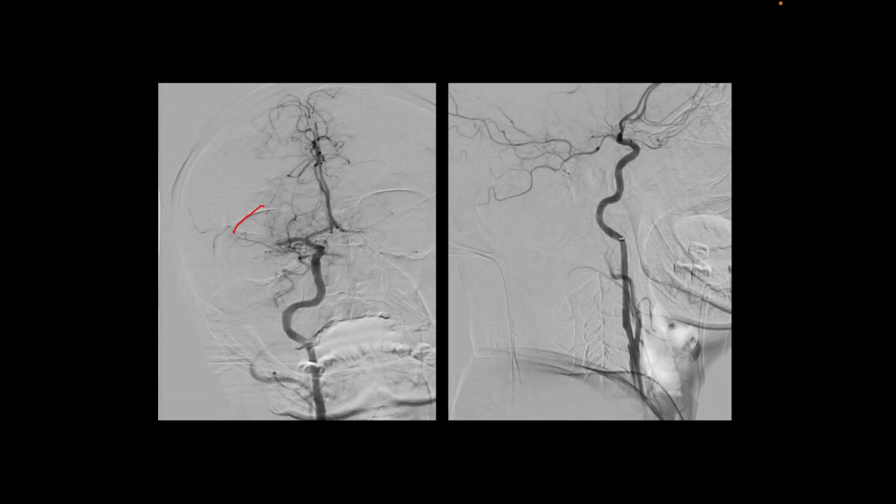Now read the angiogram. On the right side, we can see the AP view angio. That is the internal carotid artery. There is a loop here. This loop here, and the distal carotid also is almost normal. It's a very straightforward, clean carotid, and then it divides into the right M1 and A1. A1 supplies both.